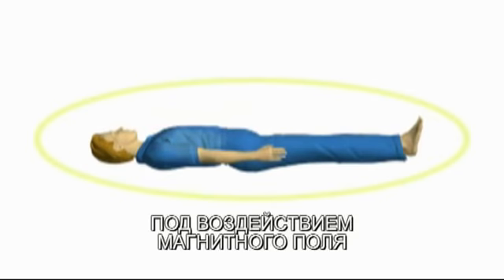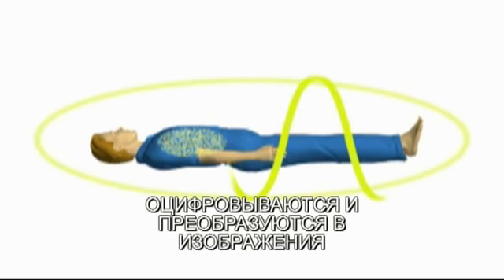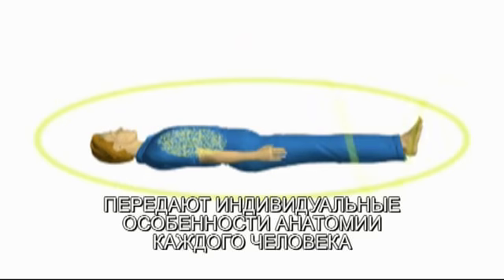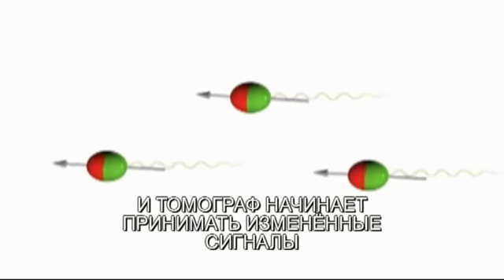A radio wave is then used to excite the protons, which resonate and emit varying signals which are received, digitized, and displayed as images. Different signals emitted by different body tissues are then used to differentiate individual anatomy. When tissue is damaged, its composition changes and gives off an uncharacteristic signal. So when displayed, that damaged tissue is distinguishable from surrounding healthy tissue.